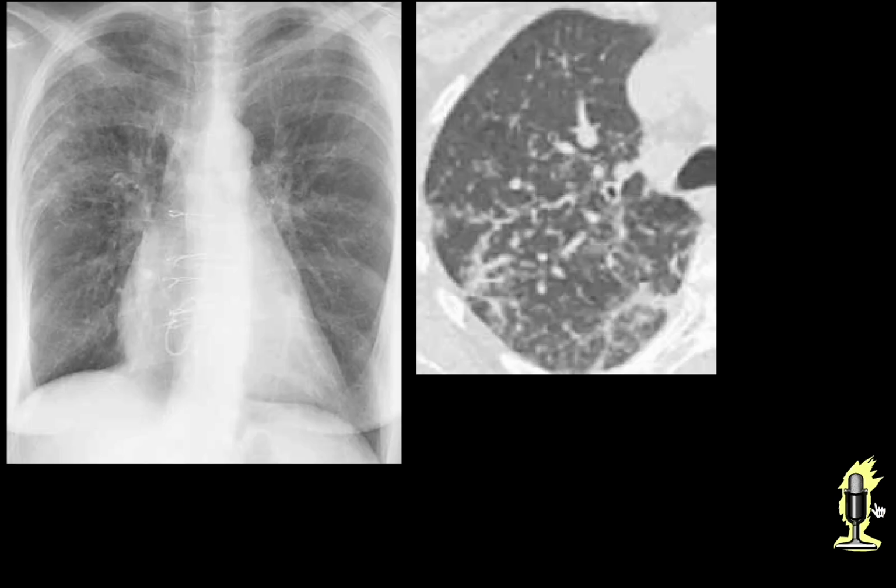Note the distribution in the mid and upper lung zones, particularly the right upper lobe, at chest radiography. Many of these diseases have a proclivity for the right upper lobe. At CT, nodules are clustered around blood vessels, are prominent in the centriacinar portion of the lobule, and are visible along the edge of the lung in the periphery of the lobule.